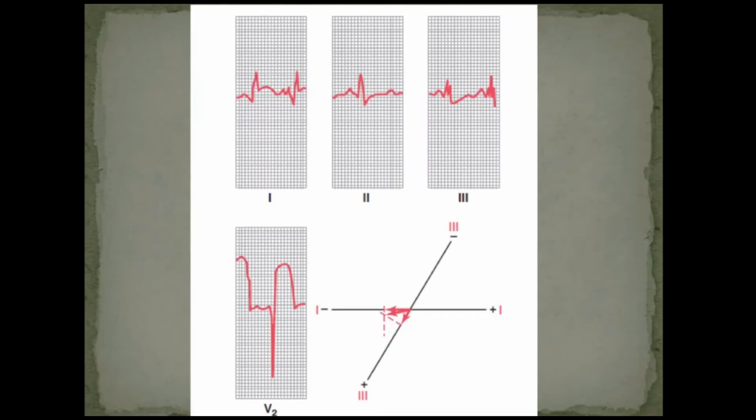Step 6 is analysis of injury potential in the chest leads, that is lead V1 to V6. As you can see here, the QRS complex is ending here. So from the J point, we have to draw an isoelectric line. And from this isoelectric line, we have to draw a vector just at the end of the TP interval or just at the beginning of the P wave. As the ECG is lying below the zero electric line, the vector is negative. So there is a negative vector.